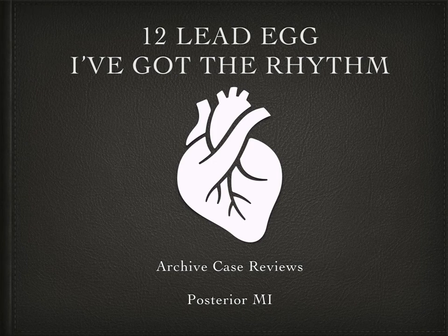This is a short video looking back at some of the ECGs posted to our Facebook group so we can use them again to help us with our learning. In this episode we will be looking at 3 cases of posterior MI.